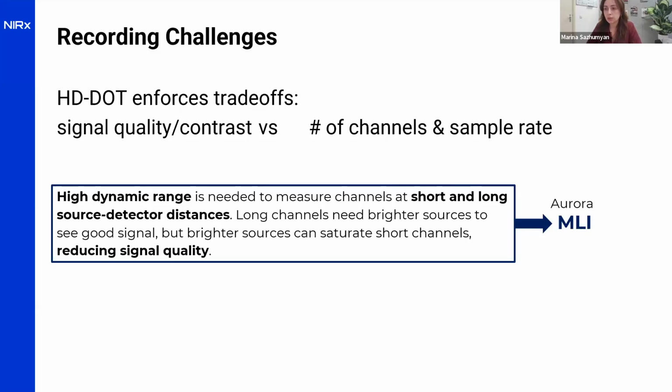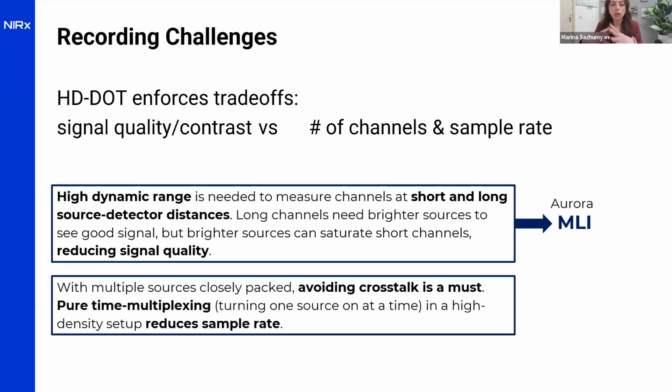So the downside of this, however, is that by increasing the time steps, we are trading off the sampling rate. So this will result in a reduced sampling rate. Also, increasing the number of channels, increasing the number of time steps is going to affect our sampling rate.